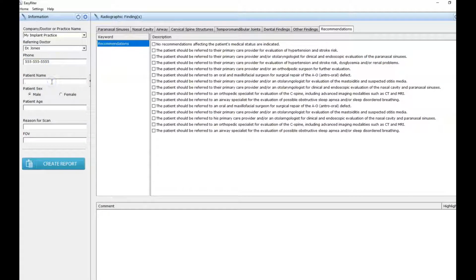The patient, my favorite patient, Ms. Ida. That's my favorite patient. She's a female, of course. Hope you're laughing out there. We're going to make her 65 today, hopefully with no COVID-19. Just kidding.